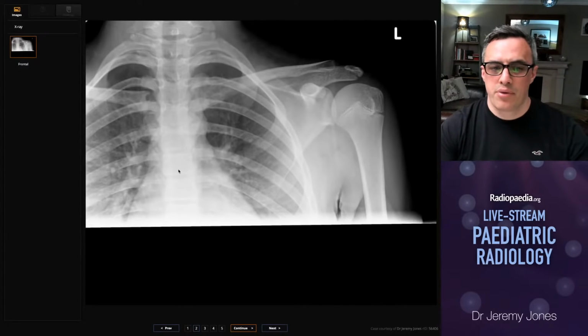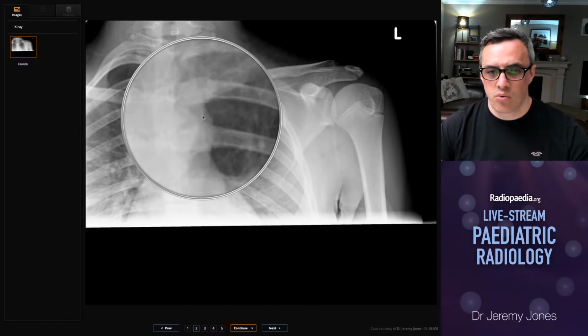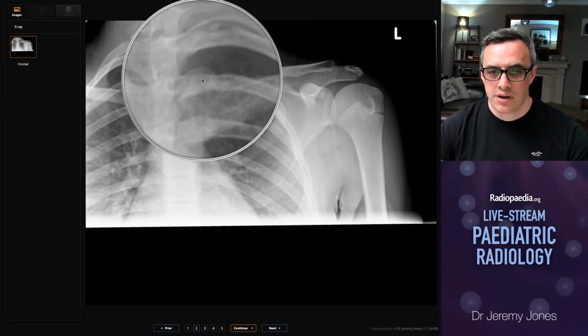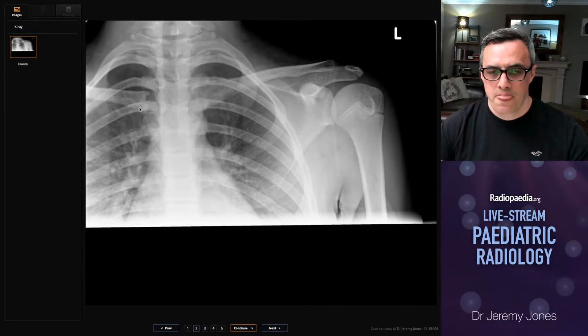Well, actually, if I put this up in a Viva for my trainees as they're approaching their 2B exam, I don't give them any history, and it's very easy to walk past the fact that this clavicle here is way bigger than this clavicle. So the left medial clavicle is much bigger than the right. And it's not just bigger in its bony extent.